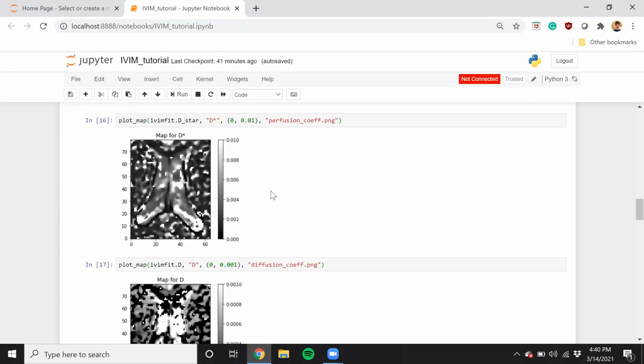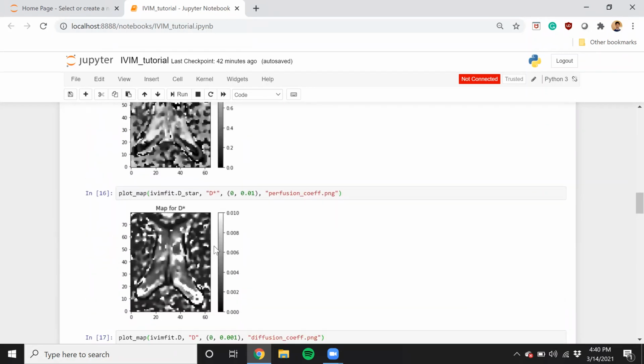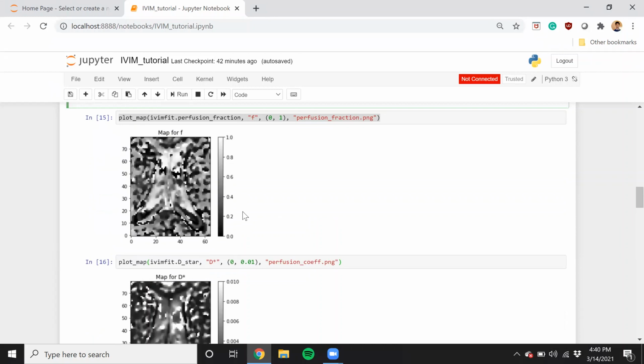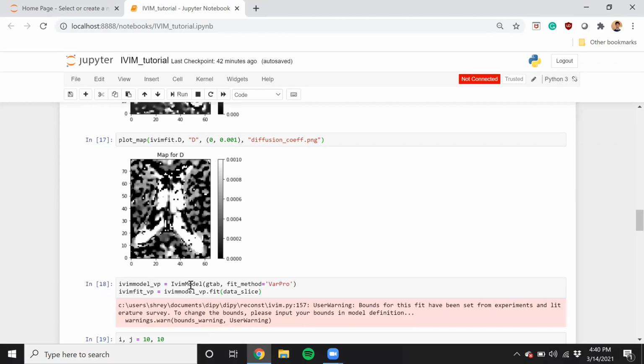As you can see, the segmented fit is kind of noisy, as expected. And since it's a convex combination, you can see things that are opposite, in the sense that here it is overfitting. You can see that there is a lot of misclassification, essentially.